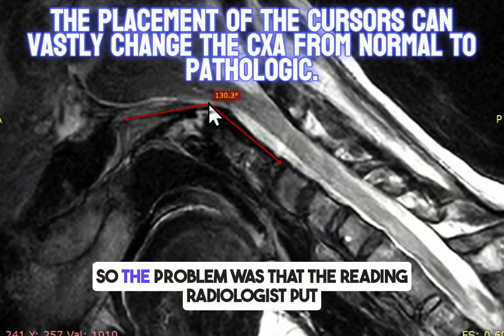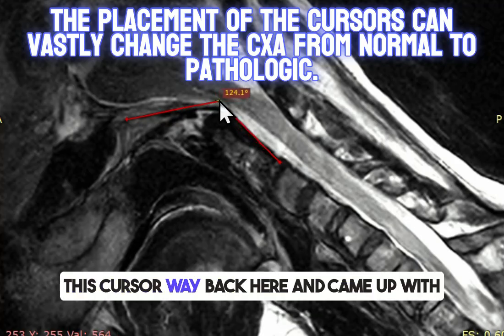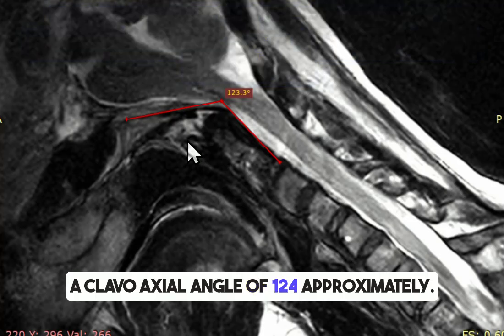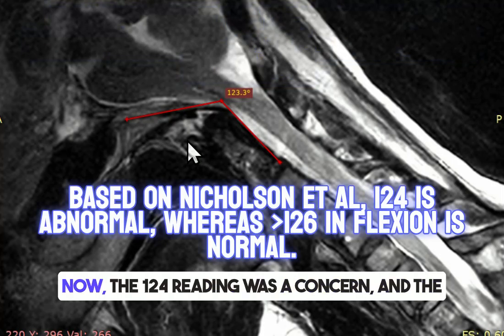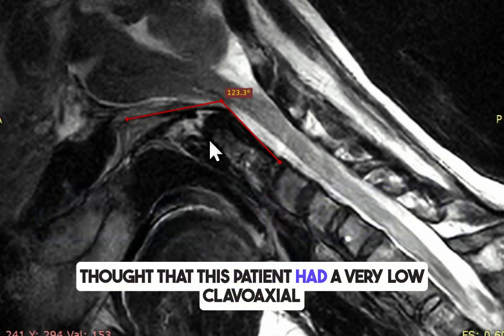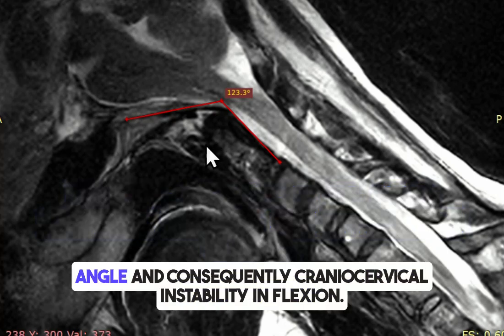So the problem was that the reading radiologist put this cursor way back here and came up with a clivoaxial angle of 124 approximately. Now, the 124 reading was a concern, and the physician that sent this patient to that imaging center thought that this patient had a very low clivoaxial angle and consequently craniocervical instability in flexion.